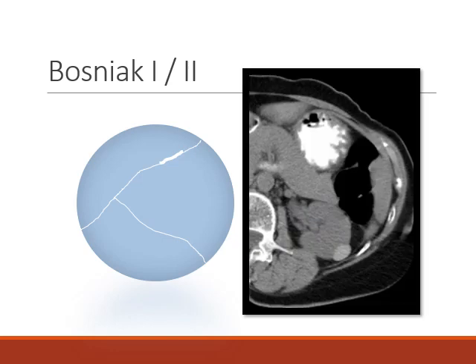This is a hyperdense cyst on a plain scan. Obviously, to define a cyst as hyperdense, you need to have the pre-contrast imaging. The pre-contrast will show it to be of high density, and then the post-contrast will confirm a lack of enhancement. They like to put this in exam questions. If all they've given you in the question is a post-contrast scan, you cannot call something a hyperdense cyst. That's a silly thing to do, and you will lose a mark for no reason.